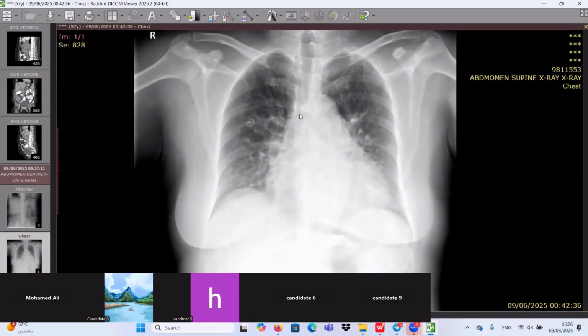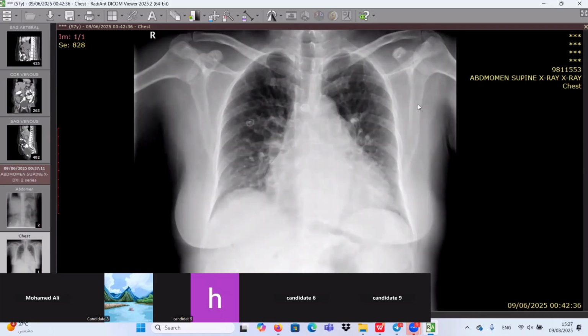bone. So you checked the lung fields, you checked the mediastinum, you checked the heart, behind the heart, you checked the breast, you checked the bones, you checked the soft tissue of the chest wall. Yeah. What is remaining? Lung apices are unremarkable. Lung apices is very nice. Trachea is central. Central. The rest of the bones are unremarkable.